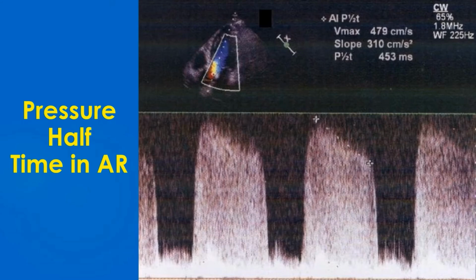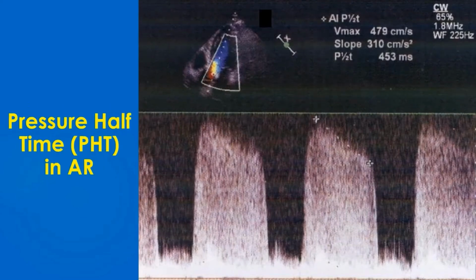Apical 5-chamber view with color Doppler is seen in the upper left corner of the image. The Doppler cursor is seen passing through the left ventricular outflow tract and aorta. Aortic regurgitation jet is seen as the positive tracing above the baseline.